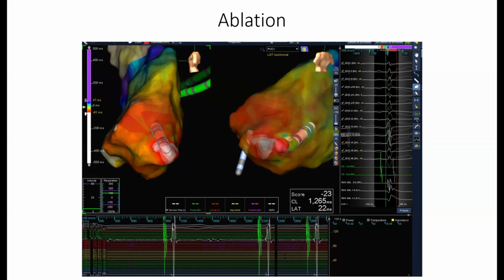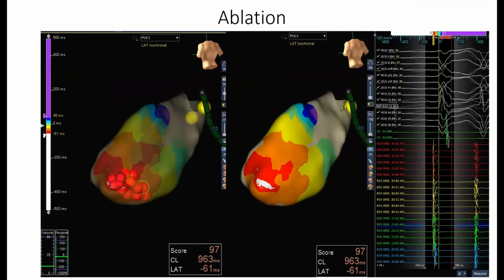You're not understanding what I'm saying, right? Yeah. About across the lateral wall to the lateral, there's a small spot. So the question I have is whether the mapping, here also you have two white spots, a tiny one and a big one. Do you see it? Yeah.